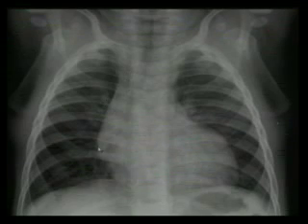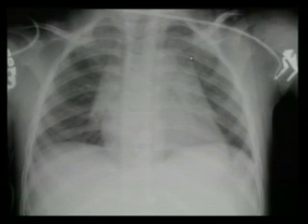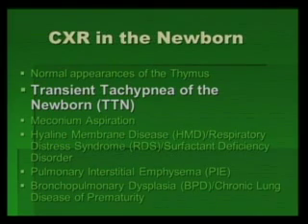Here, if this was you and I, we'd have a mediastinal mass. But here is an asymmetric opacity on the right. This is just an asymmetric thymus. Here we have the straight margin. Straight margin is almost a sail sign, but this is the thymus. If this is you and I, we have a mediastinal mass. Here is a very asymmetric thymus, but this is part of the thymus as well. And here it looks like there's a mediastinal mass in this kid, but this was a rounded thymus. So you just have to realize what the thymus can look like.